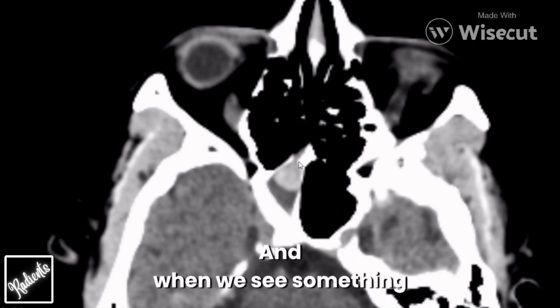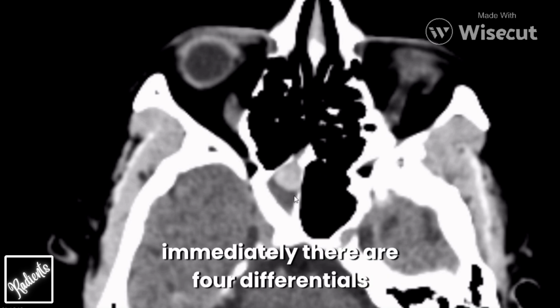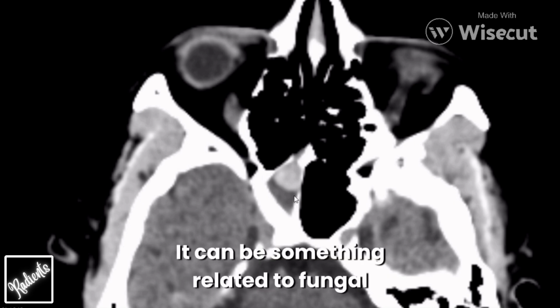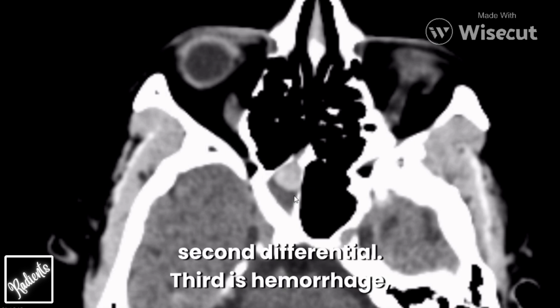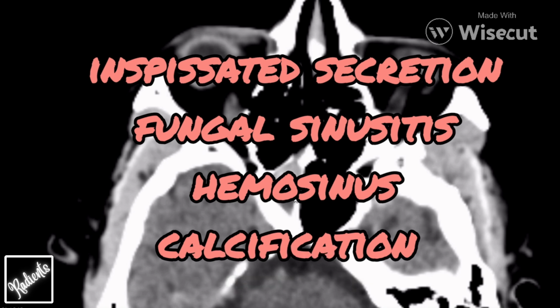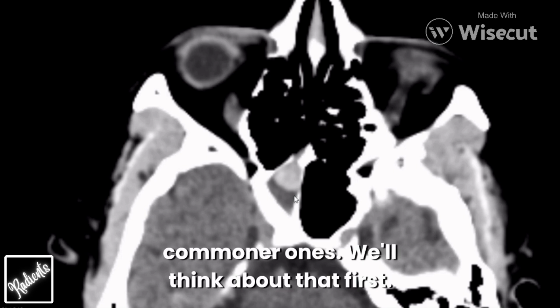And when we see something that is hyperdense inside a sinus, then there are four differentials that should immediately come to our mind. First of all, you have to think about the most common thing, that is chronic inspissated secretion. It can be something related to fungal infection of the sinuses, which is the second differential. Third is hemorrhage, and fourth is calcification. So these are the four things that you need to think about: fungal elements, chronic inspissated secretion, hemorrhage, and calcification. Okay, so first of all, the commoner ones, we'll think about that first.